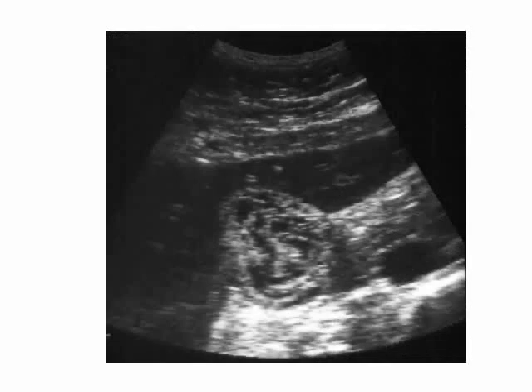This is a hepatitis with a gallbladder wall thickness, but this is not common. A lot of hepatitis have nothing that you can see in ultrasound. The diagnosis of hepatitis is with the laboratory examinations.